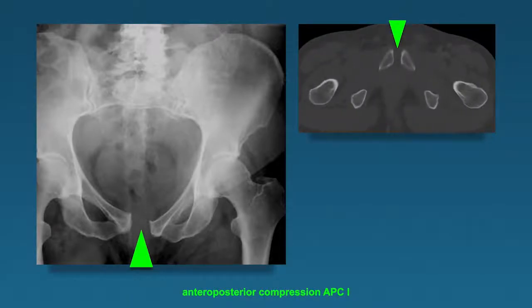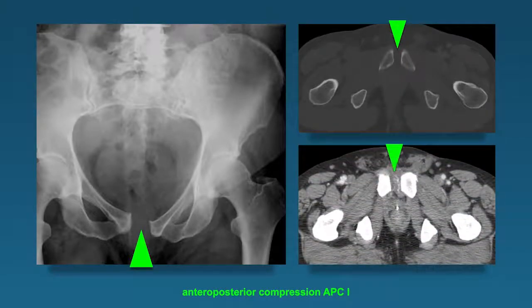Remember, when you're imaging these patients, they may already be placed in a pelvic binder or have a sheet tied around them. So some of these injuries can be reduced at the time of imaging. Take a look and see if you can identify if the patient is in a binder or tied up with a sheet in some way. Notice that this patient is in fact bleeding anteriorly, in between the symphysis, on the soft tissue window that we see over here.